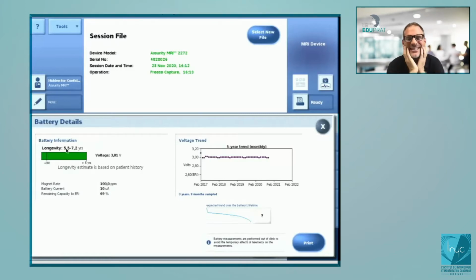Like this, it means that if you do not change anything, no parameters, and the percentage of pacing remains the same, the duration should be around 7.2. But if for any reason the device now requires 100% atrial and ventricular pacing, then the duration will be 5.5.